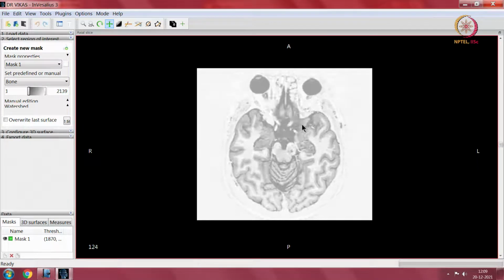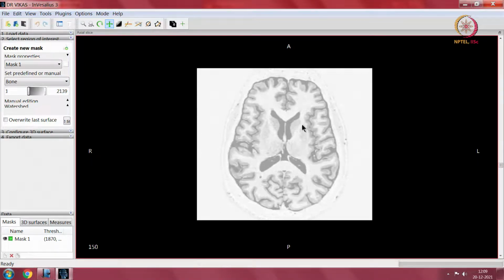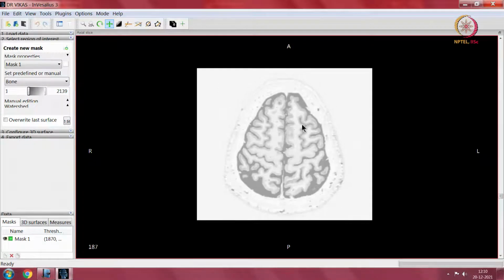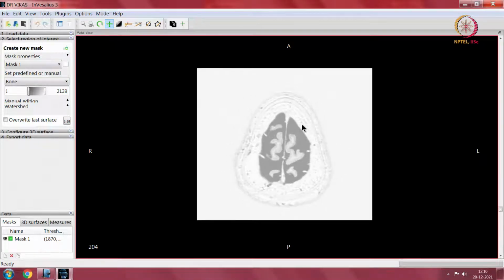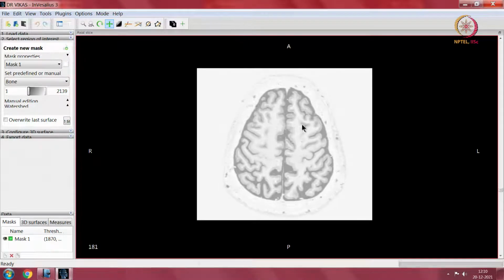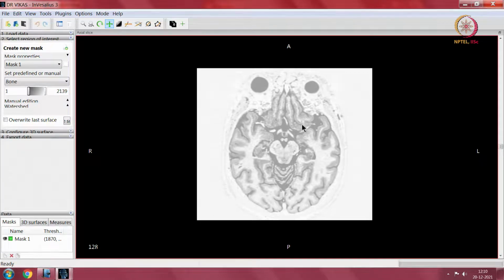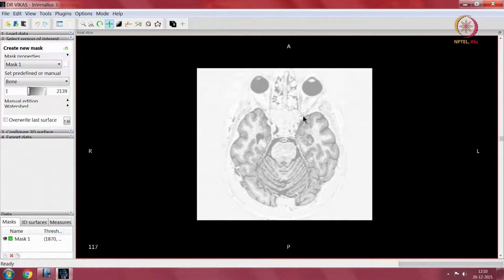Now we are scrolling up towards the scalp, above the eye. There is no eye seen over here. That is how we scroll above. This is an axial slice, remember again. Now we have reversed movement, going down to see the eyes back again here. These are the two eyes again. We continue down to see the nose.